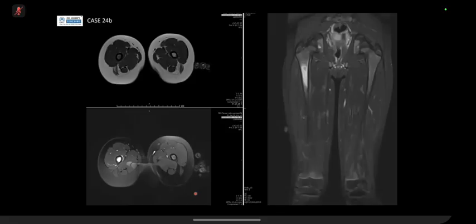No, I can't think. Okay, so are you quite confident? Are you going to tell them that's it, we're going to leave it alone, we're not going to do anything more, or are you going to say, I want to do more stuff? You can choose to repeat imaging. You can choose to do another scan, a different modality. What will you do next? I would like to do a CT scan of this.